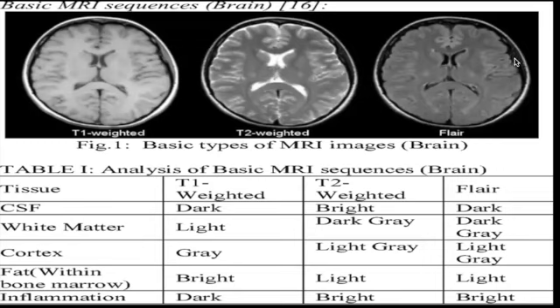It's fairly easy if you look at the white matter. If you look at the central white matter here, you're going to notice that on the T1 it's much lighter than here on the FLAIR, which is much darker, okay? So this is a very basic way for you to be able to identify. However, if you're asked to compare, you need to know these five structures and how to compare them.